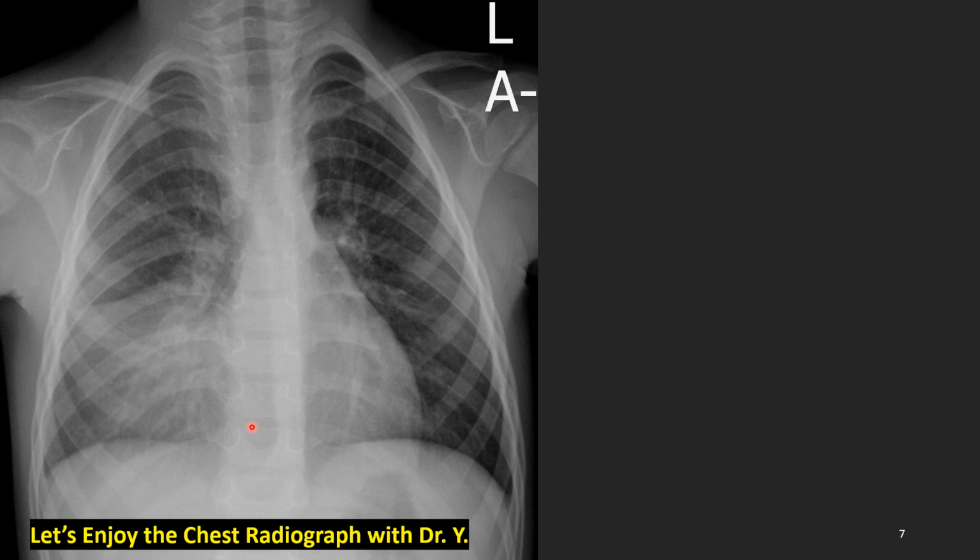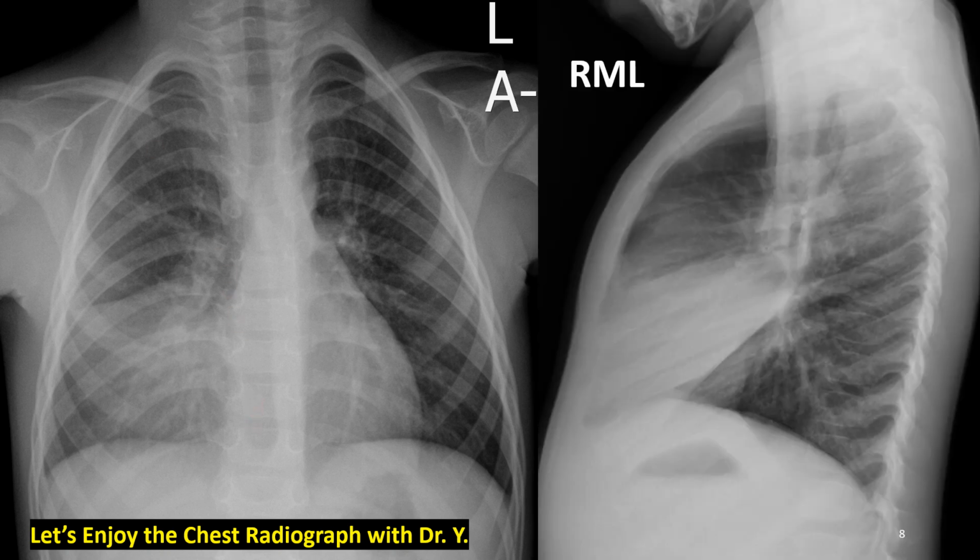If you are not confident about this diagnosis, please go back to session 2, normal anatomy, or session 6 about silhouette sign, and then come back, please. How about this lateral film? Does it match? Does this concur with your idea? Yes, we see triangular shaped consolidation. Upper border is minor fissure. Lower border is major fissure. That's correct.